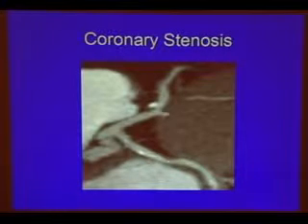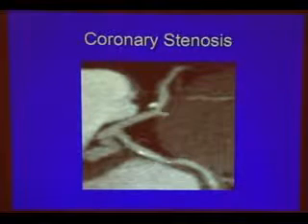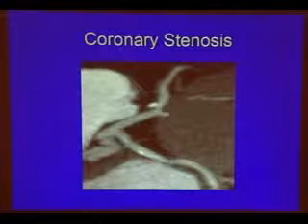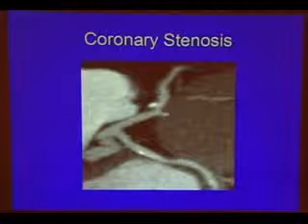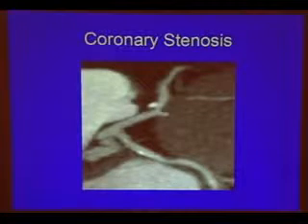However, over here, we see another plaque which is not calcified, and it's actually composed of fatty plaque, and there's actually a little bit more significant stenosis here. So what we do is, again, take non-contrast enhanced images followed by contrast enhanced images to evaluate the plaque.